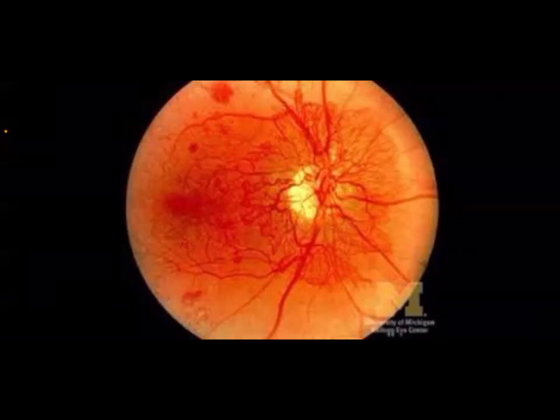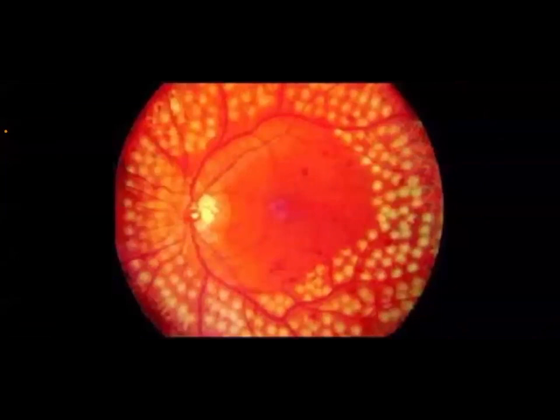In later stage or severe disease, they will do pan-retinal photocoagulation, or laser therapy. If you can see the screen now, this is how the laser therapy looks. It will be like small, round, circular, well-organized circles in the retina peripherally, or it can also be in the center. It depends on where the new vascularization has formed. But it's really important to differentiate this from retinitis pigmentosa, because sometimes with laser therapy you will find black color as if there is retinitis pigmentosa, but it's actually laser therapy.